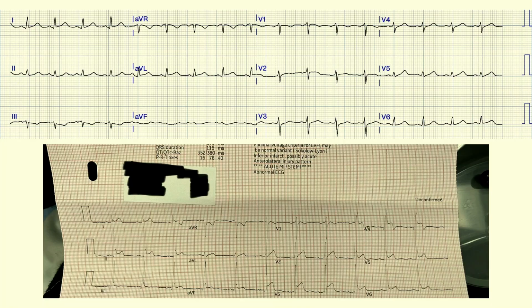This is an ECG that was handed to me in the ER. I'm not pulling any punches on you. They said, oh, you got a STEMI, and they handed it to me, and this is what they printed out. But it goes to the top of the page. That R wave is enormous, huge voltage. So if you think about it, that amount of ST elevation is basically trivial compared to that.